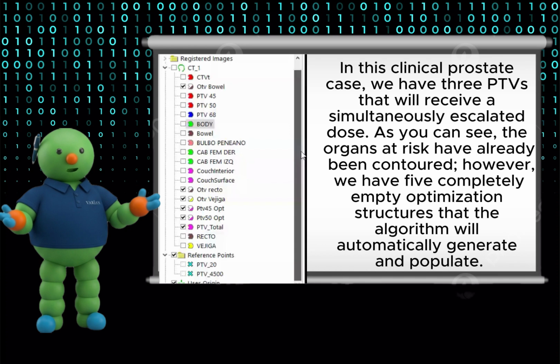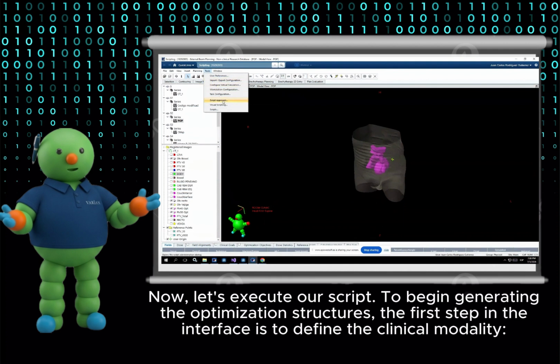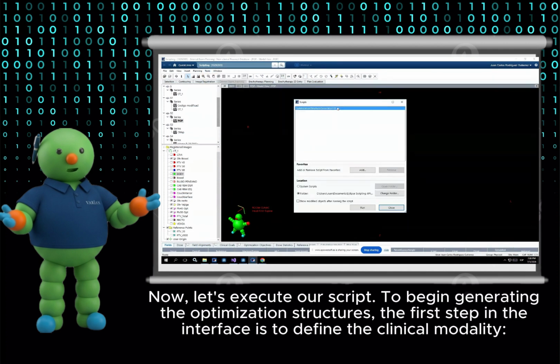As you can see, the organs at risk have already been contoured. However, we have 5 completely empty optimization structures that the algorithm will automatically generate and populate. Now, let's execute our script to begin generating the optimization structures.